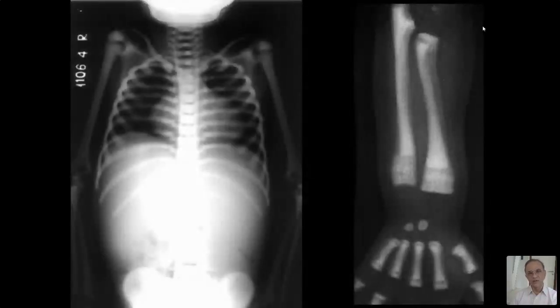So this is classical osteopetrosis. Now, this is uniform in all skeletal dysplasia. Every bone from head to foot is involved. Having said that, it's not as if every bone is equally involved, but every bone is involved. That's one way of telling that this is a skeletal dysplasia. Now, look at this increased bone density. So you have increased bone density, and all of you now see the bone within bone appearance.